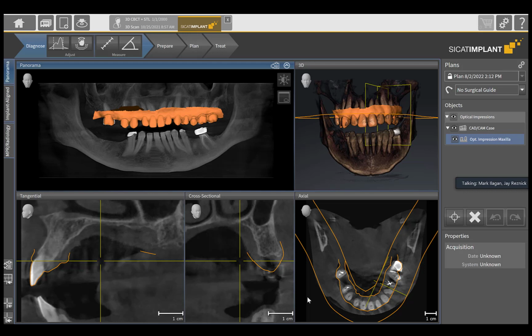So this one does not have an SSI crown from the CEREC, but we can bring that in. How important is that? Well, for the final treatment planning, I want to know exactly, or approximately, where my final prosthesis is going to go. This is for treatment planning for the implant. It's not planning the final restoration. So it doesn't have to be exactly perfect.